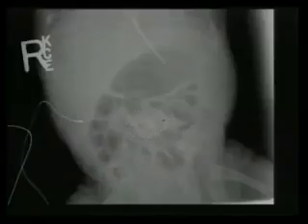Here, do you guys know what this is? This is an umbilical hernia. They're usually in African American children. Every student in here, every resident, they can have huge ones. Sometimes they'll regress on their own. They're never going to get incarcerated because there's not a tiny neck at the opening. It's huge. Bowel comes in and out.